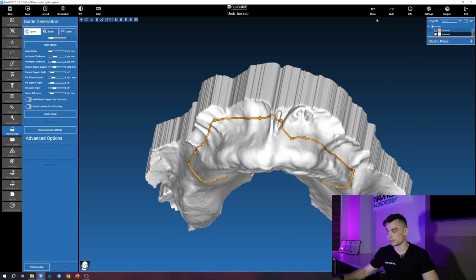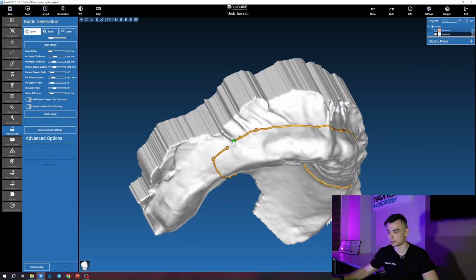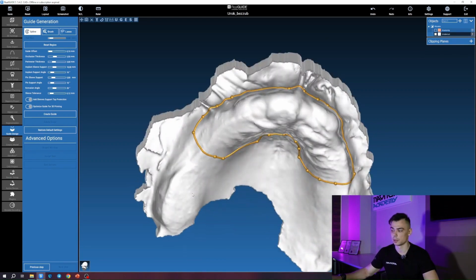But in reality, when the patient undergoes a CT scan, and in the vast majority of cases they do the CT scan somewhere else, and not in your presence, these mucosal bands, which the surgical guide will rest against, can dislodge it, meaning they can cause it to shift out of place.